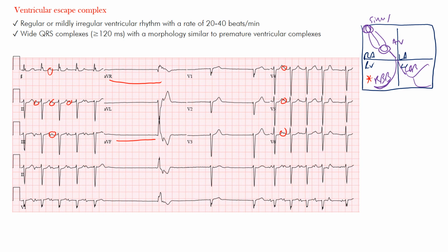All right, so sinus rhythm is present, and then there's this gap, right? Everything just stops for some period of time. All right, and you can imagine the sinus node is either there's an escape beat, or maybe it's just not functioning well, it just stops functioning. Maybe we're suppressing it with medications, or the patient is just older and has degenerative disease of the conduction pathway.